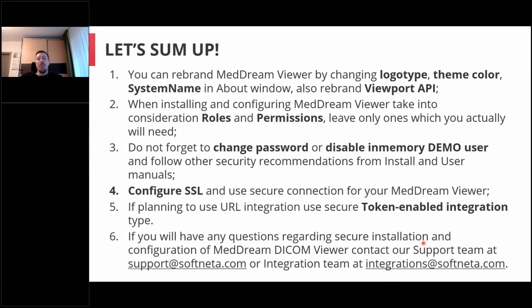So MedDream can be rebranded. We can change the logos. We can change the theme color. We can change the system name in the About window. And if you want to rebrand the Viewport API and still have it certified, you need to add this About box in place. You need to integrate it.